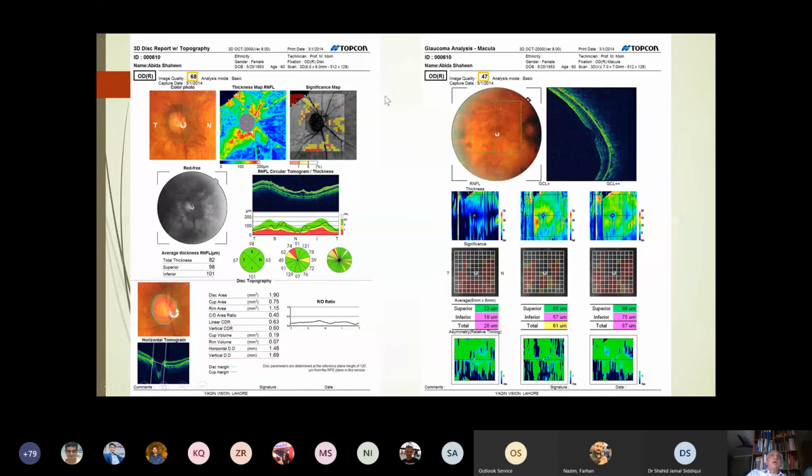Now look at the scan. It is very important to look at the optic disc and then just to look at the overall picture of the retina of the posterior pole. You see that this retina does not look to be as healthy as it should be, looks more mottled or more tessellated in appearance. Then let's see, the shadowgram shows the temperature chart.